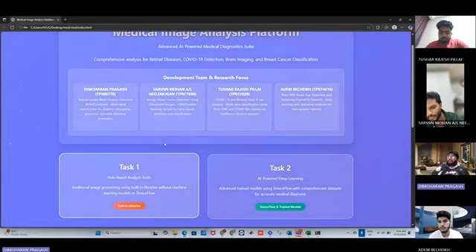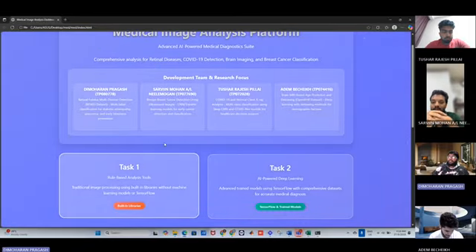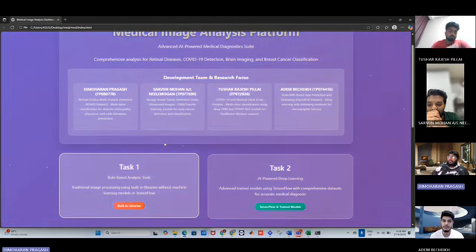Hello everyone, I'm Dimaharan Prakash, and my part of this project is about spotting retinal diseases at an early stage. Because many eye problems can silently grow and lead to blindness, I use the retinal dataset, and my system checks six types of diseases: normal, diabetic, glaucoma, optic disc cupping, age-related, and myopia, and others. It's multi-label, so one image can have more than one condition.